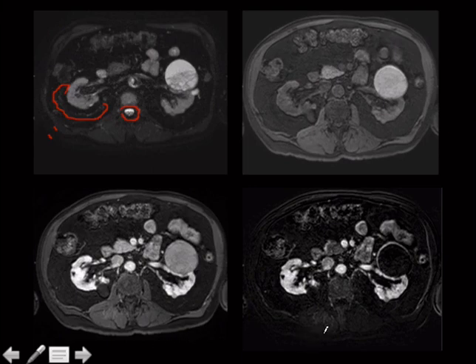And then this is a subtraction image, and let's talk about it now on why do you do subtraction. So things can be bright on T1 post-contrast for two reasons. One is that they enhance, and then the other one is the pitfall, which is that they were intrinsically T1 bright, something like a proteinaceous cyst, which this person actually has. So this is T1. We've got a bright cyst.